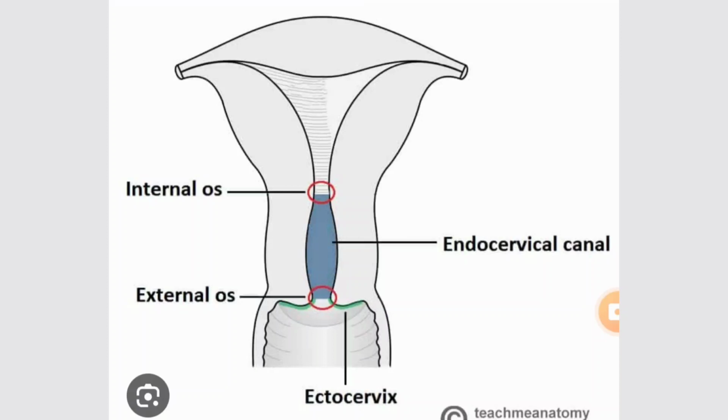Down there is another opening which is called the external os. The external os is directly communicating with the vaginal wall. In between the internal os and external os, this area is called the endocervical canal, which also has its own importance. Therefore sometimes, in cases of incompetence of the cervical area, we usually measure the length of the cervix. At that point it is very important.